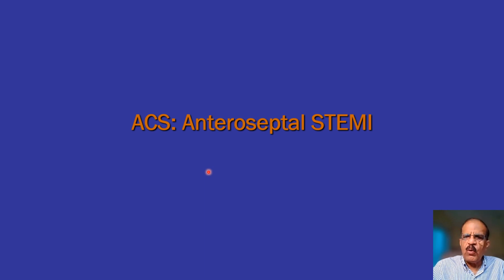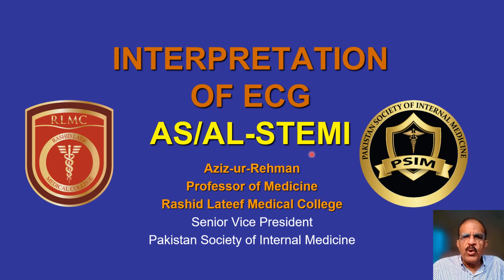Very briefly, I will quickly go through those concepts which were discussed in the last presentation, last video. You could consider it as revision, or those who land up here directly, for them it would be useful. In this module, we are going to take up anteroseptal and anterolateral STEMI, which constitute the whole anterior wall. So we will show you different slides showing you anteroseptal and anterolateral or anterior wall infarction. Rest of the infarctions will be covered in remaining videos.